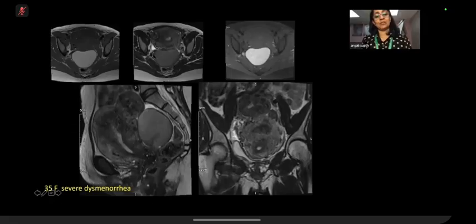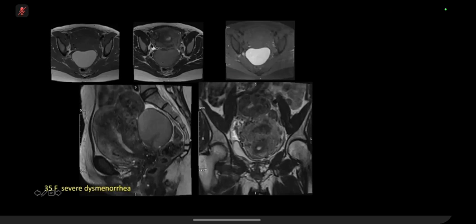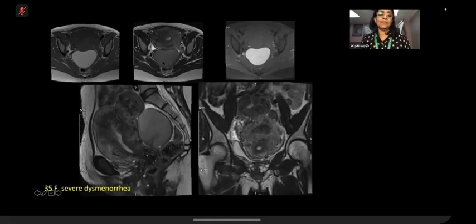If you have endometrioma, you can have ovary anywhere, isn't it? It doesn't have to be textbook; it can be positioned in the pouch of Douglas anywhere. So if you're seeing in the pelvis, at the right or left, or in the pouch of Douglas, a lesion like this without any solid components, be confident you can call it an endometrioma. And we are seeing the beautiful T2 shading in this case.